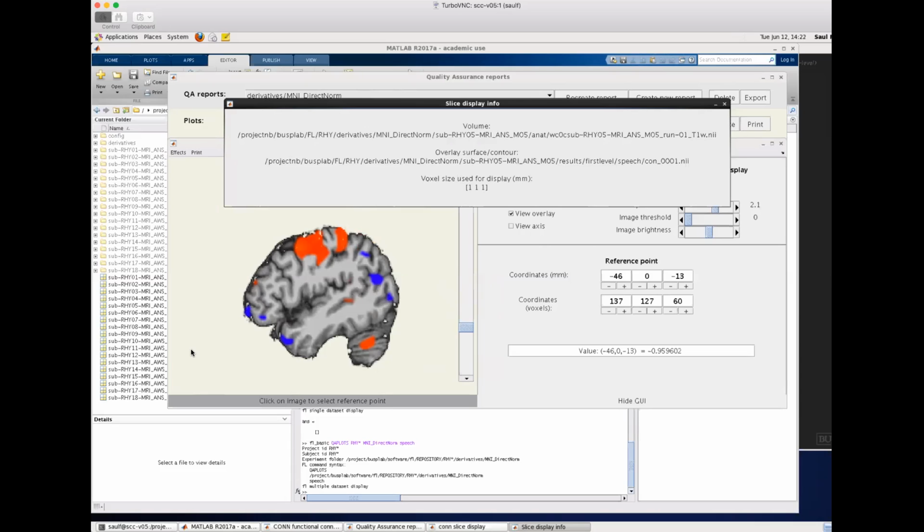I also noticed that when I was comparing by loading the same images in Freeview, the ones in the QA report looked a lot more like the T maps than the effect size contrast maps. Is that possible? That could be. It might be.